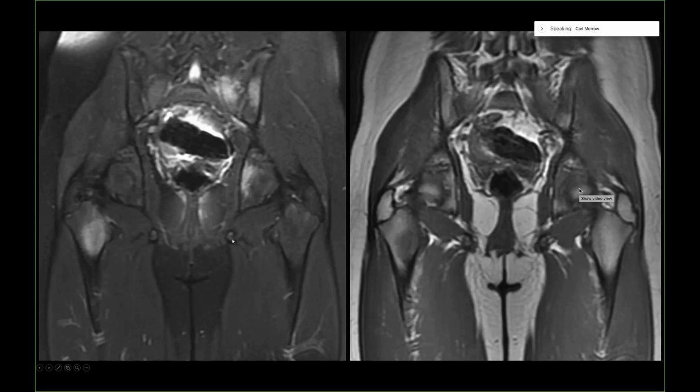the T1. Has some other lesions here in the left ischium that comes up to the triradiate cartilage, but the cartilage itself looks okay, and the other side, the cartilage in the ilium, looks okay. We've got left iliac bone involved here with a similar lesion, again, kind of poorly defined margins, both on the STIR and T1, and then some definite sacral ala involvement as well.